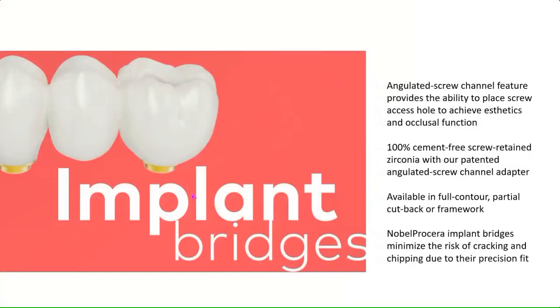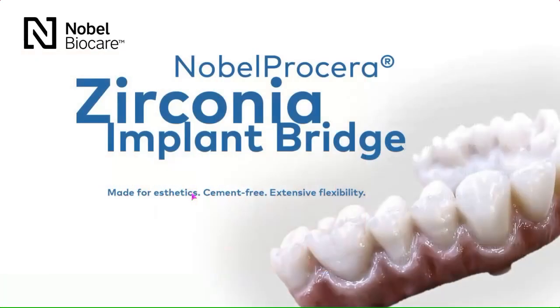NobelProcera portfolio. But of course, our implant bridges, which has really been a flagship restoration of ours for a very long time, starting this in the industry quite a while ago. These are 100% cement-free. They do come with adapters. And our NobelProcera zirconia implant bridge is really the flagship product of our NobelProcera portfolio. Again, this bridge has really changed the game in many ways, which we'll talk about, but high aesthetics, high strength, and a lot now flexibility, which is built into this restoration.